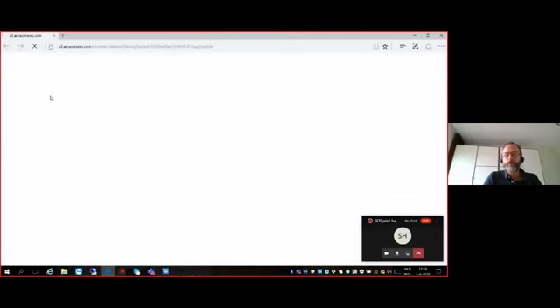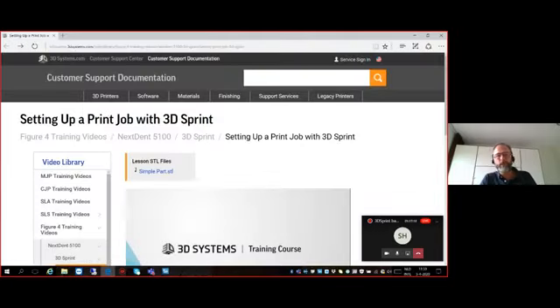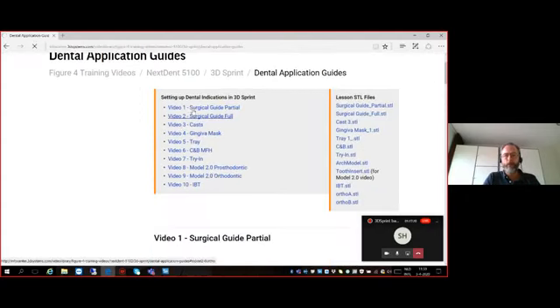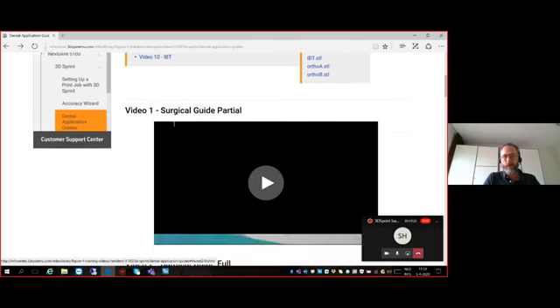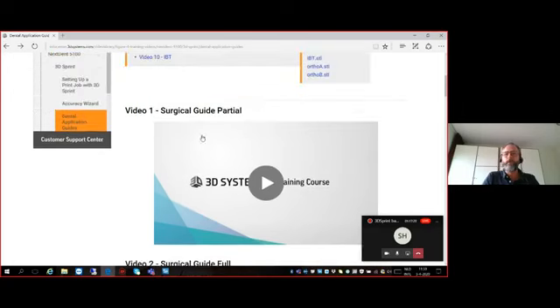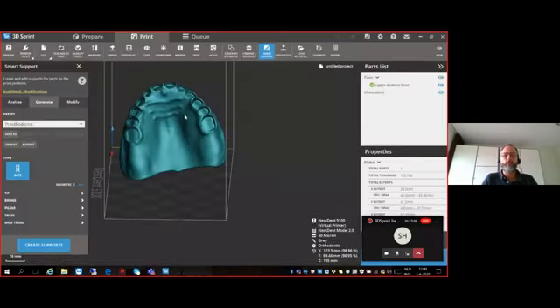And this is very nice, especially if you're new with an application. You can find all the different dental application guides here, and we have instruction videos on each and every application. So everything I showed you is more or less here in this video as well for a specific application. So if you are new to the software, you're starting to print dentures or surgical guides or models, it doesn't really matter. You go to the best practices and there you can find a lot of useful information to help you begin to use 3DSprint.